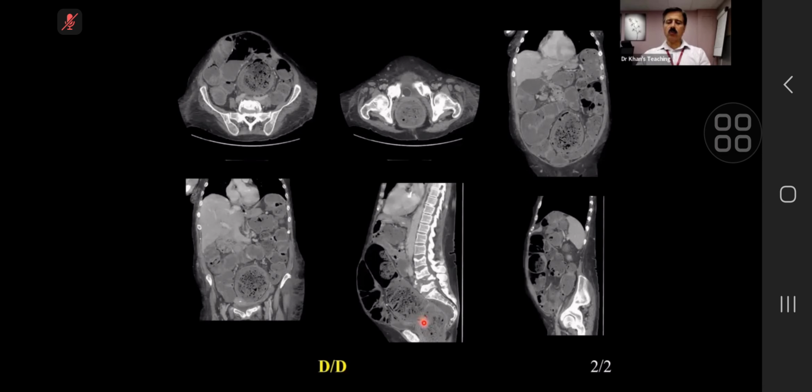This is a case of pseudo-obstruction, chronic pseudo-obstruction. And pseudo-obstruction, as I told you before, we'll see in cases of bed-bound hospice patients, things like that. Because of chronic constipation, they are like this. If you compare it with the previous films, it will also be like this. And every 3-4 months, they might be coming to your A&E. And in these, the criteria for dilatation is different, as I told you in the table. Up to 22 centimeters has been documented.